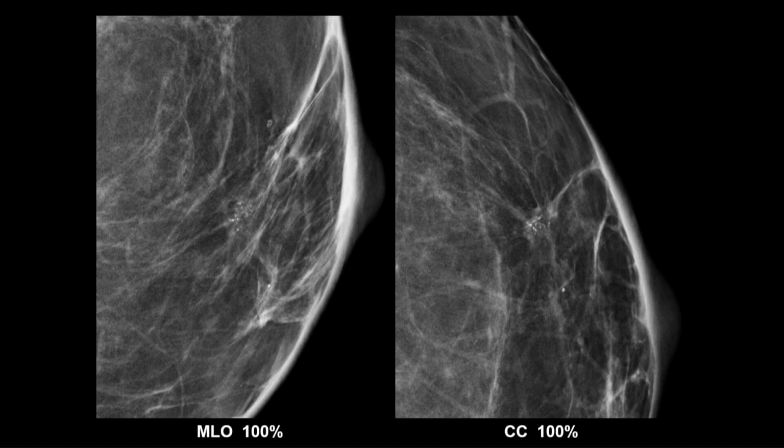the radiologist wants you to come back and have more pictures, but we also, more importantly, want to get your previous exams, because they may make it obvious that you don't even need to come in. So don't schedule your exam, but let's get the information about where you had your prior exams. If you don't know, ask your doctor. They can look up your report and they'll tell you exactly where they were obtained and when. And then we get them and then we look. Well, let's see what happened in this case.